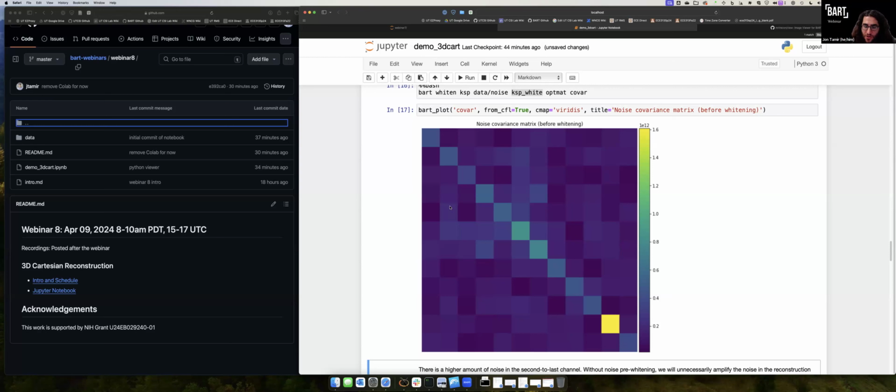Beforehand, there was some noise covariance matrix, so the data were Gaussian with a particular noise covariance matrix C. And so this doesn't do any denoising explicitly, like we're not using some kind of function that tries to estimate the noise and remove it. We're basically just equalizing the channels. And so it's a non-destructive operation. You can go back to the original data if you'd like.